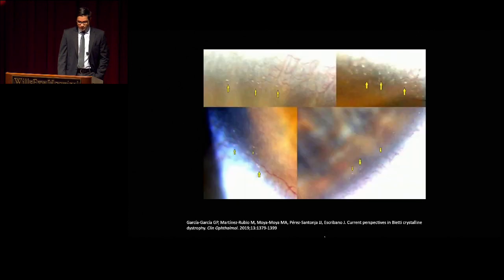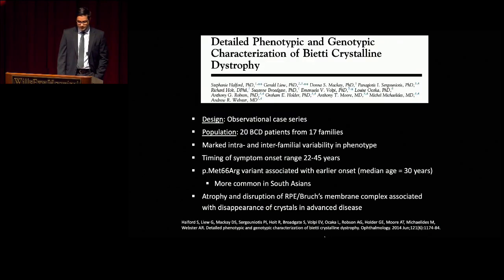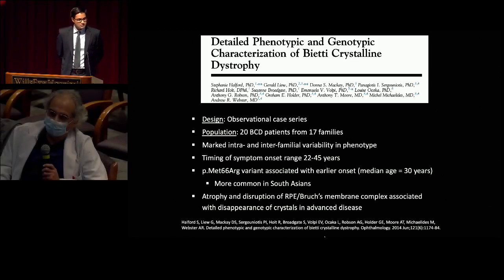Just moving along, this is a representative photo showing these perilimbal corneal crystals here. Dr. Polito, just a question for you. How would you counsel this patient on his long-term visual prognosis? It does progress, and we talked about it because he's a professional.